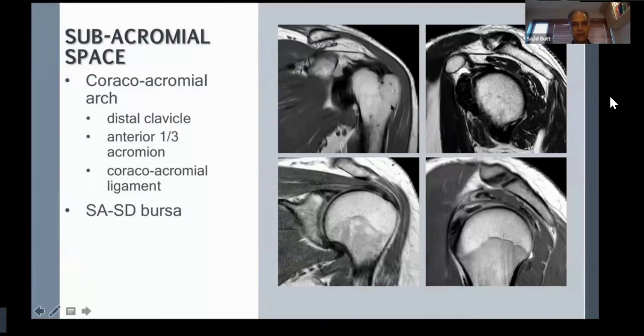So that's the medial side, that's the lateral side. You've got your deltoid under the skin on the outside. Then you've got the acromion, and you can see the deltoid is attached to the acromion. And beneath this fat space, this is the subacromial space here. Anteriorly, we can see that from the top of the coracoid process, we've got this fibrous structure which goes laterally towards the acromion.